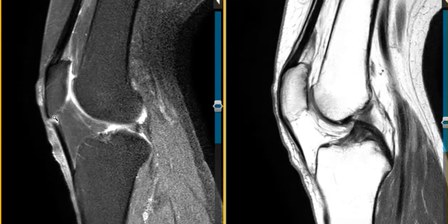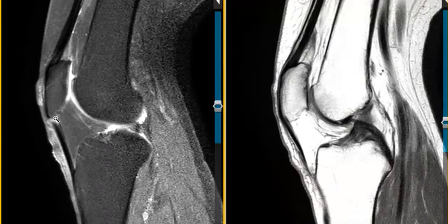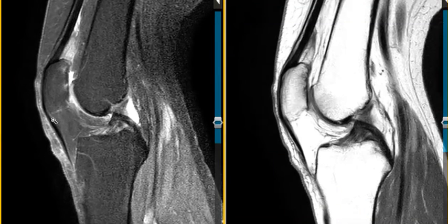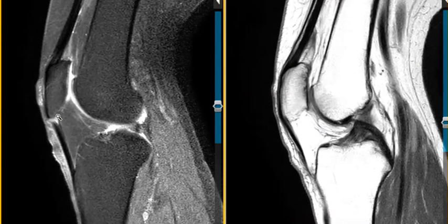The second finding is right here along the bottom of the kneecap. We have the kneecap here. Along the bottom, we have the patellar tendon that comes down here, attaches to the tibia. It looks nice down here, but at the attachment to the kneecap, we see brightness. This is a little bit of patellar tendinosis, irritation, micro tearing right there where it attaches. Along the edges, the medial and lateral sides, it's intact, but just centrally, there's a little bit of edema.